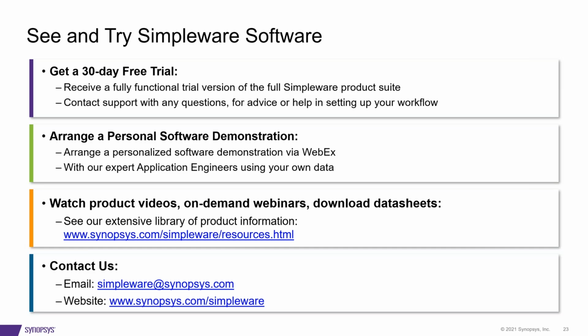And then the next step is custom modeler. So that's where we train a tool specifically for a customer. If you have a high throughput and you have the data, we can train an AI tool specifically for you and really get to the 99% level of one-click segmentation. And this is for people doing hundreds of thousands of CT scans per year. So yeah, that's kind of the range of automation that we've got. I don't know, Ross, if you've got anything to add to that.